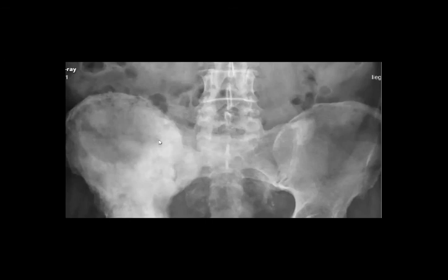Lesion involving the right iliac. Okay, sclerosis. So can you mention whether it is diffuse or focal? Focal or diffuse or both? I mean that the sclerosis is more localized here, but if you compare this with this, I think again you have sclerosis here, right? And just one thing, Amna added, very nice, thank you Amna. You always come on time: enlargement and thickening. Yes. So there is enlargement and thickening.